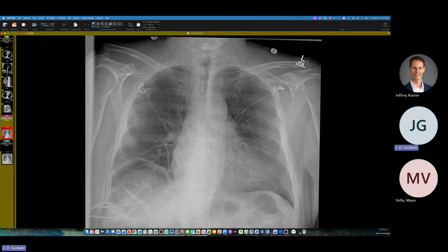Okay, so this person had lung transplantation at an outside hospital, and a couple of decades ago, often we would see these anterior rib cerclage wires, in addition to the more localized transverse sternotomy wires, approximately. So you'd often have these big butterflies of wire that went out to the sides on both sides to stabilize the whole thing.